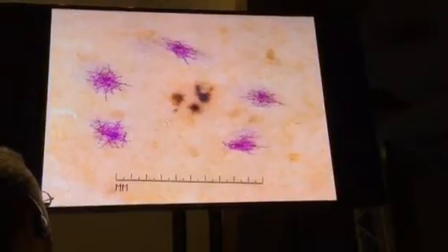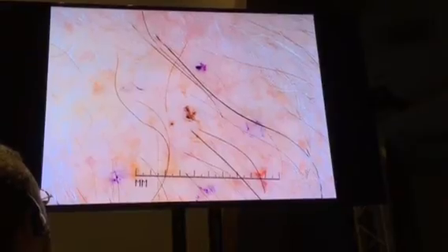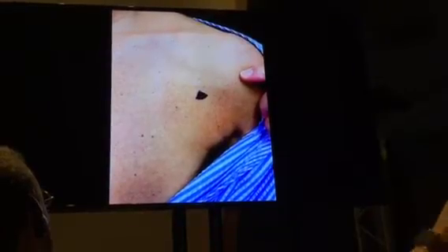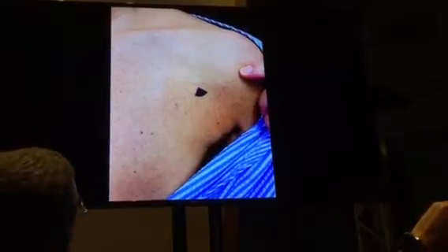As you go forward though, you can see smaller and smaller examples of basal cell carcinoma that essentially have the same exact structure and allow you to identify very small lesions. This is a recent example from my clinic. This is primarily a pink lesion clinically. On dermoscopy, you see the lesion here. It's mostly pink, but there's a small little area here that I'll highlight. You can see that also appears a little bit like a leaf-like structure. So they can be very useful in these subtle lesions as well.